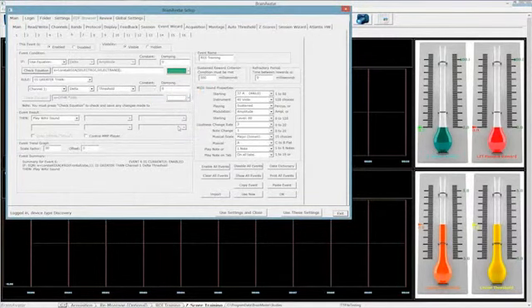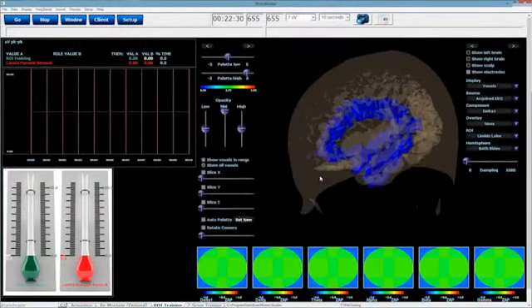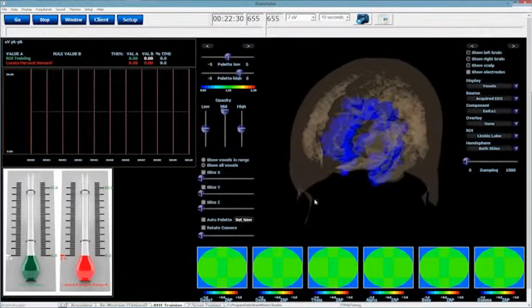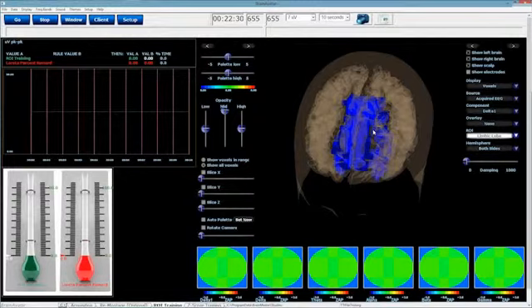What am I doing right here? By typing in these two functions, I am going to let my ROI and my band be decided by the display that you guys all know and love, the ROI head map. So as I change what I'm looking at as my component and what I'm looking at as my ROI, the training and the data that is coming in is going to change accordingly. So it is a very powerful thing, and it's very easy.